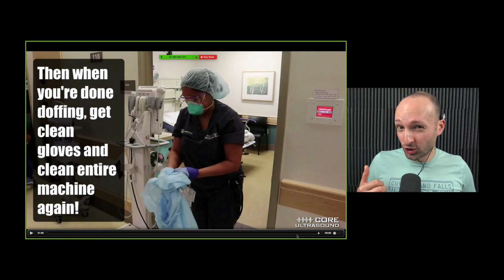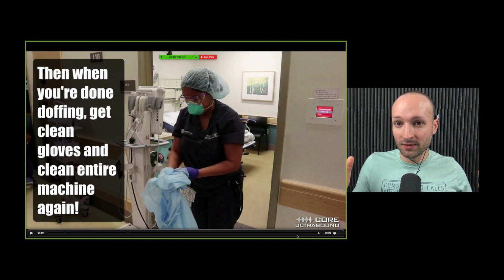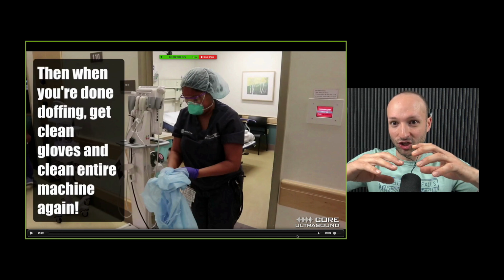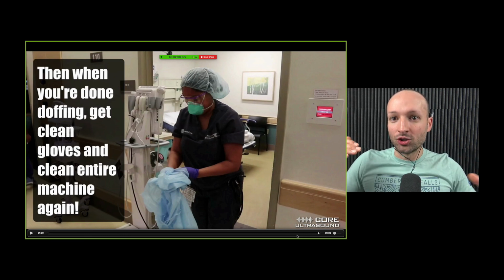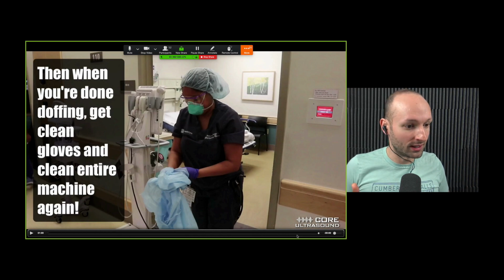There definitely are alternatives and extra things that you can do. For instance, there are some people that I've talked to that have actually put plastic sheeting on the ultrasound machine. You've got to be careful with this as well, because ripping off the plastic sheeting can actually cause it to spread. If you're ripping off the plastic outside of the room, that movement can actually shower particles outside of the room. So there's different ways of doing this. Do whatever is accepted in your institution, talking with infectious disease and whoever's in charge of the ultrasound at your institution.